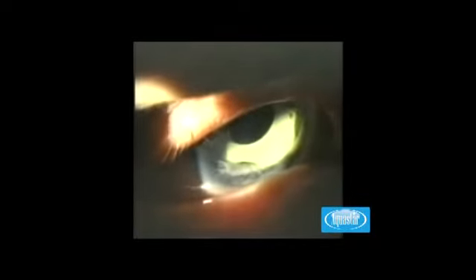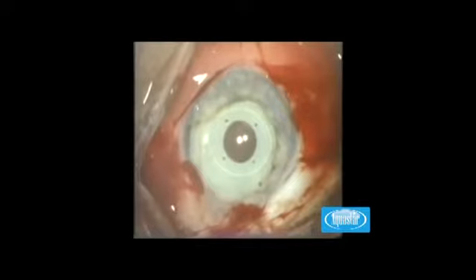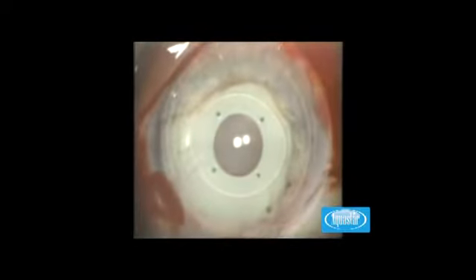In addition to the double and single elements, as an option, an IPS fixation ring is available. Depending on the findings, it represents additional stabilization for the artificial iris reconstruction. Finally, the different color variations also allow the surgeon to take the cosmetic situation into consideration. The IPS, iris prosthetic system, extends the possibilities of surgical procedures in cases of iris deficiencies combined with cataract surgery.